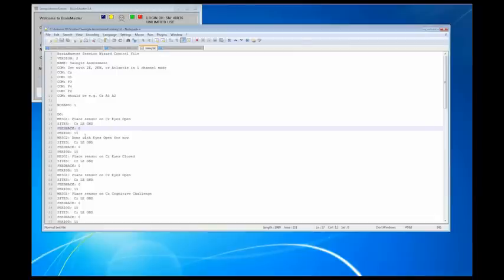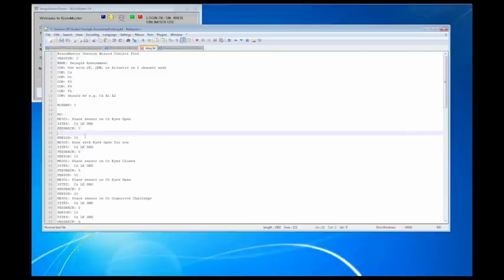So what I'm going to do, just so we can move a little bit quicker and aren't watching about 2 minutes of just staring at a screen, is go to the second one right here. I'm going to stick with the first one. I'm going to type feedback 1, and I'm going to type duty 50.